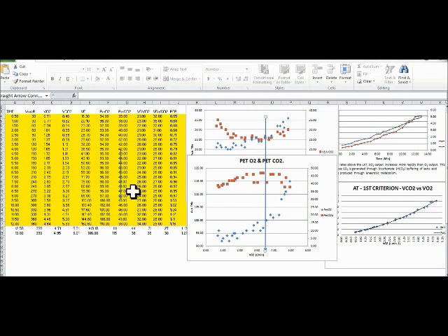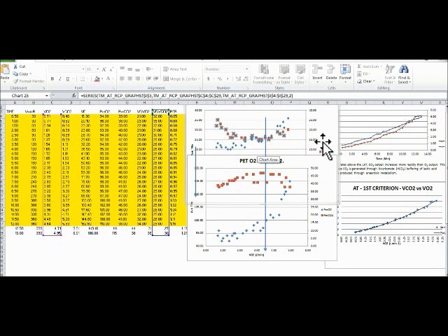So we're going to use this arrow here if we can grab it, and we'll bring that close so we have it on hand. Okay, so first thing, let's look at VeVCO2. VeVCO2 is going to be the red here, and where do we see the red starting to level off? I would say it's right about there.